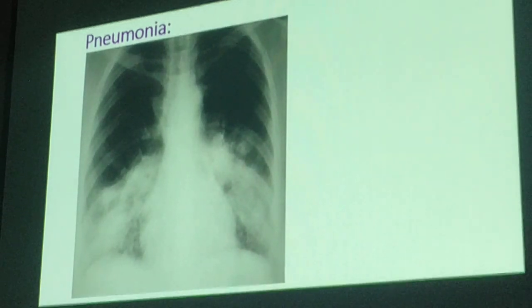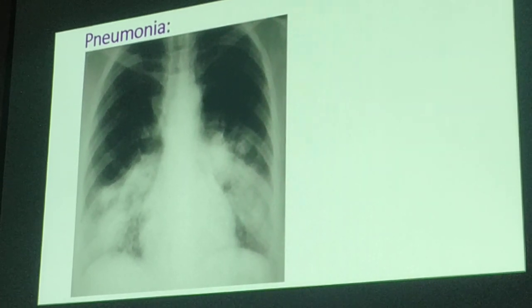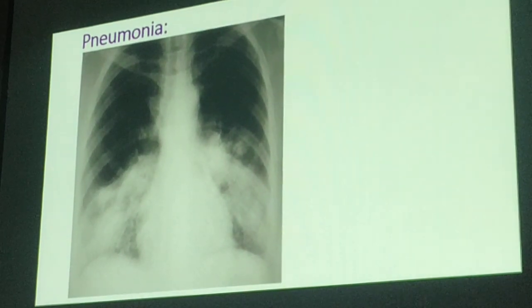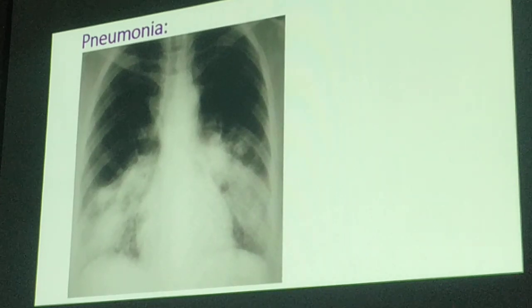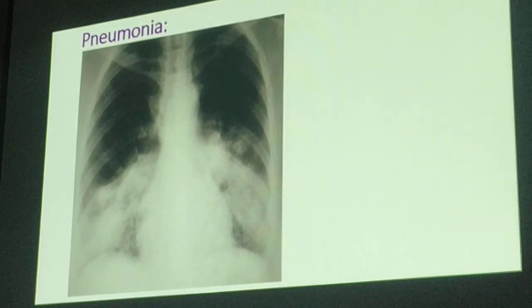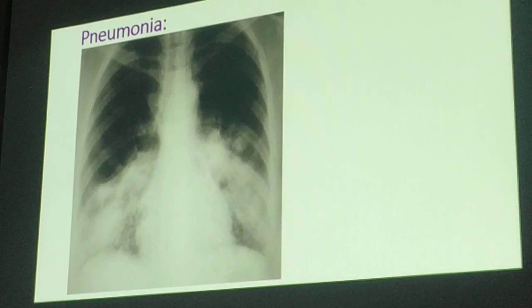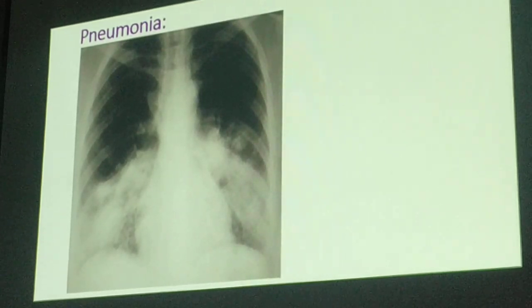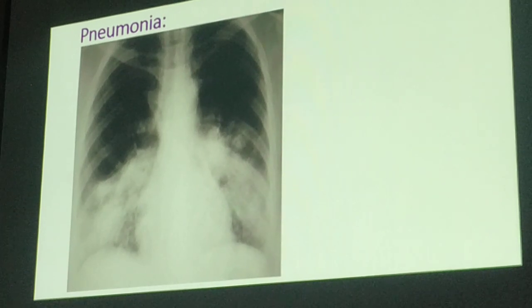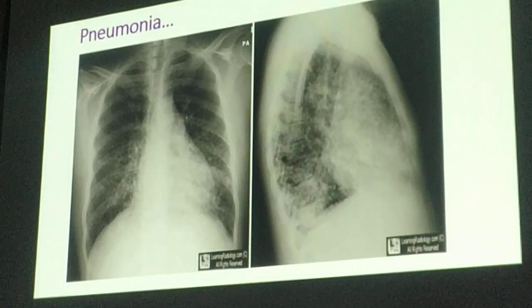Okay? So, advise your patient, when it's already moderate pneumonia, tell them, we will repeat the x-ray after one week of treatment. Okay? And you would be surprised to see a significant result. Okay? So, those that you identify as moderate pneumonia, please, do not lose them to follow-up. It should be close follow-up. Okay? This one.